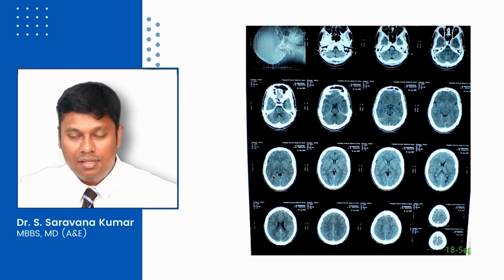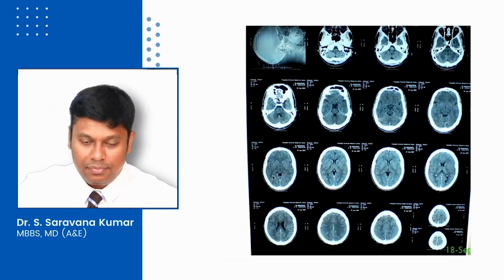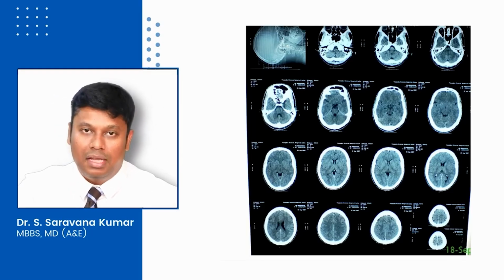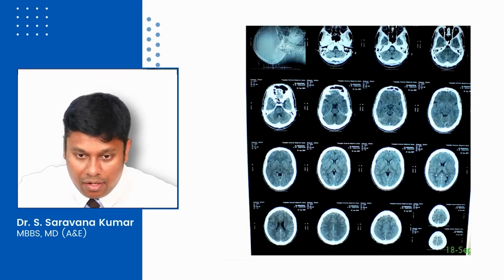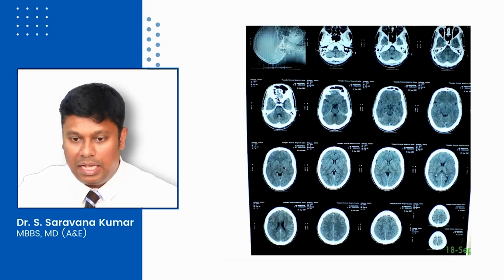Can you assume what it is above your quadrigeminal cistern? It's clearly your area of thalamus, third ventricle and internal capsule. Have a look at it closely in the image I am showing you. You've got the third ventricle, you've got the thalamus right next to it. You've got a wing-shaped structure here which is nothing but your internal capsule.